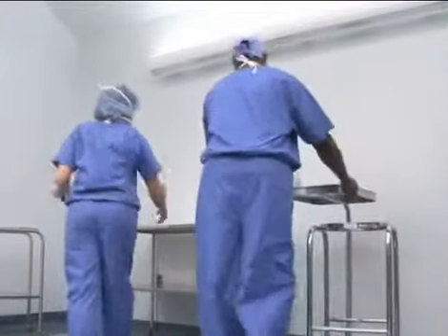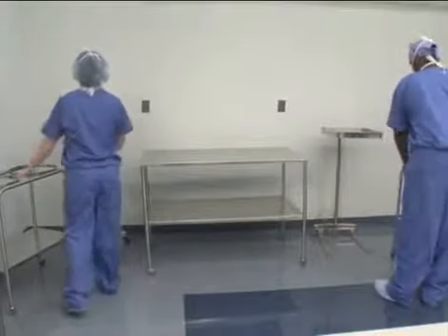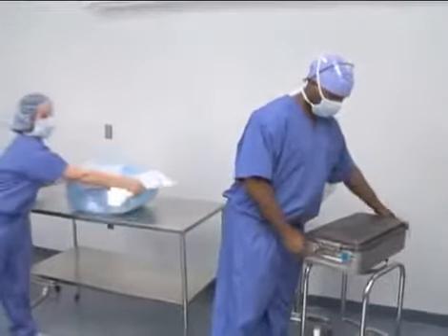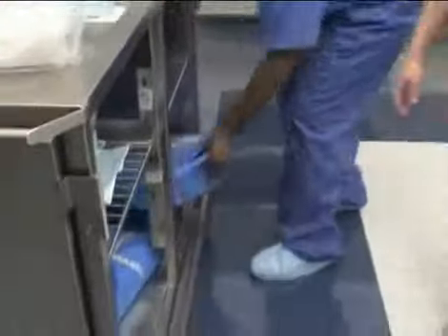Opening a case means to prepare the surgical suite for a procedure and open sterile items. All equipment and furniture is arranged, and sterile supplies are brought into the room. Depending on the complexity of the surgery, the amount of equipment to be prepared, and the degree of the emergency, the scrub and circulator open the case about 15 to 20 minutes before the start of the surgery.